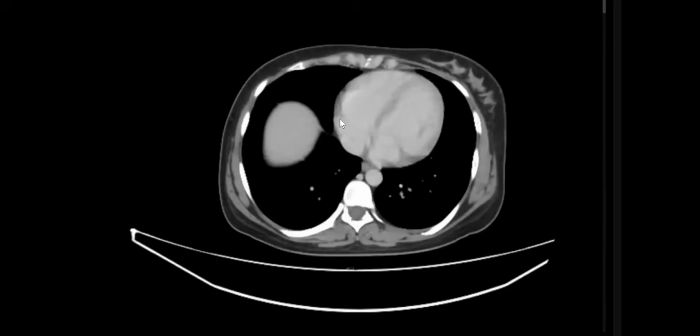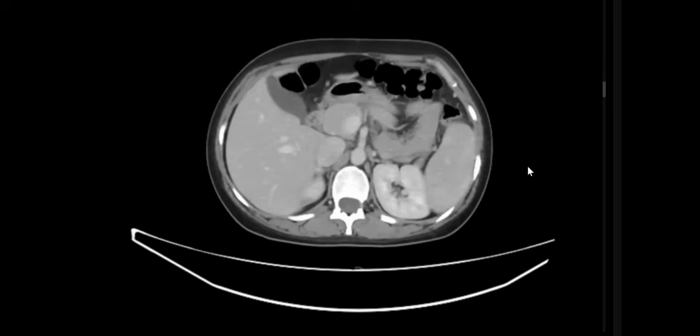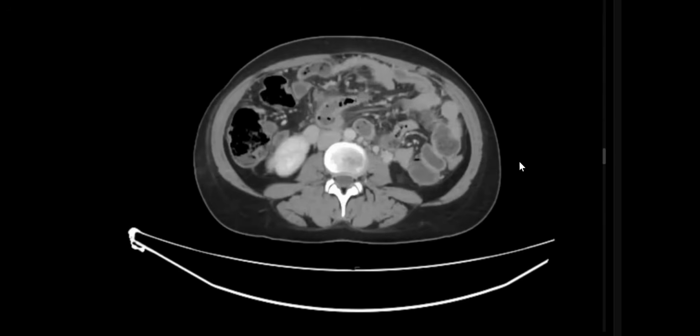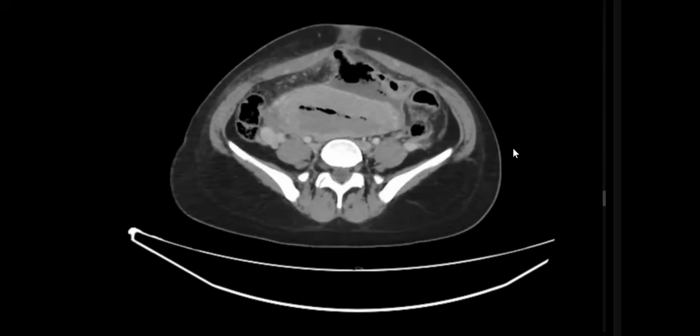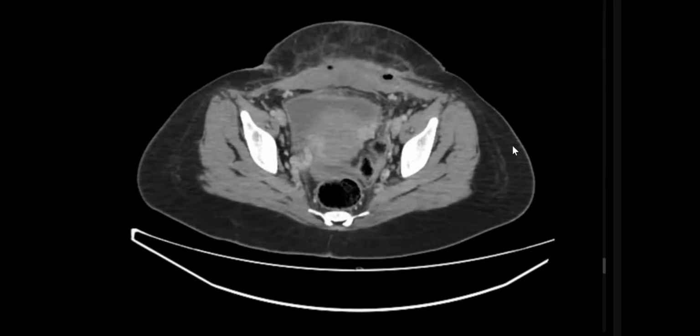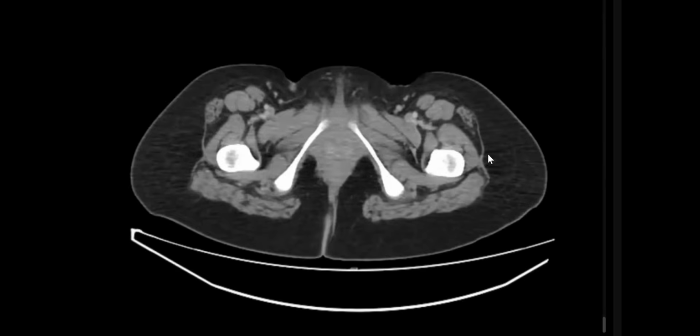Okay. What about this case? The same complaint. 2 weeks post-cesarean pain and fever. Yes, sir. I'm presented with CT scans, portovenous phase images of a female patient who's having pain and fever post cesarean section. And I would like to scroll the images from the first to last before giving my comments.